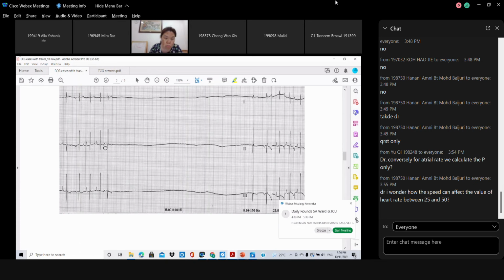Sick sinus syndrome? Not really, because you have your P's all here. This one has no P only. You have a P, but P is not appearing here. So P, Q, R, S, T. I don't even know if it's a P, but instead of waiting for the P to say something, this one comes in already.